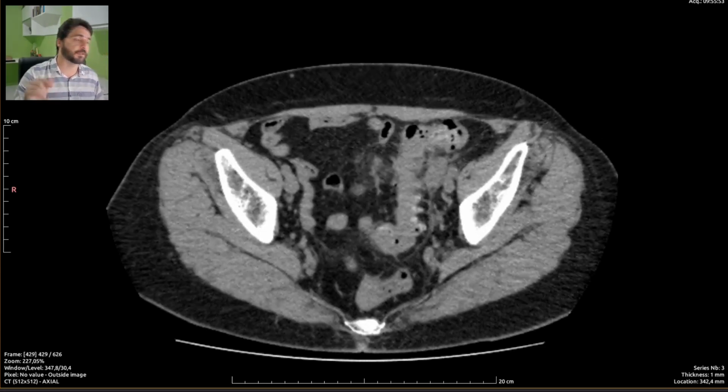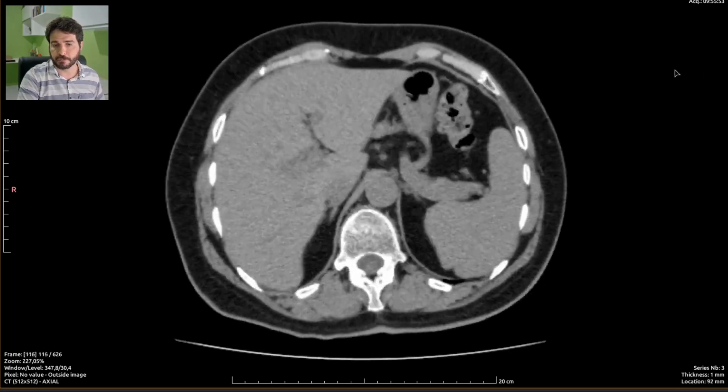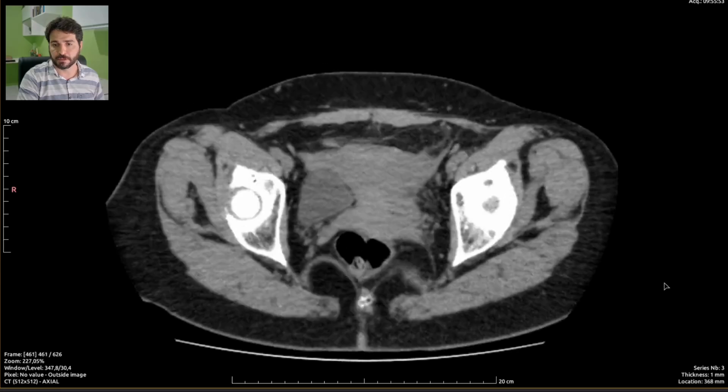So I'm going to report this case right away. Feel free to stick around or move forward to the next timestamp of this video.